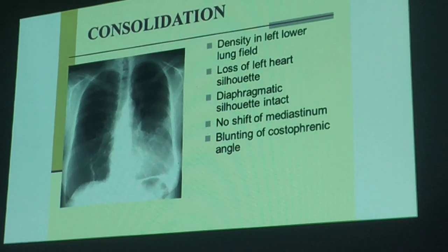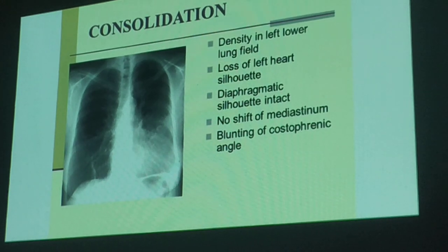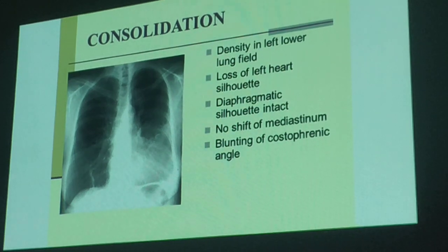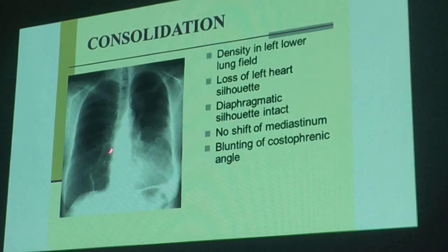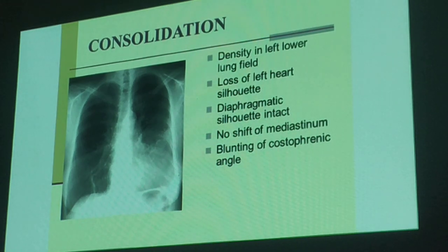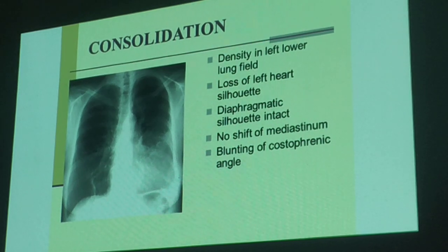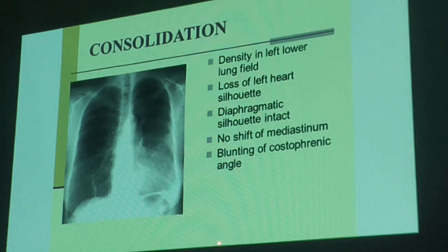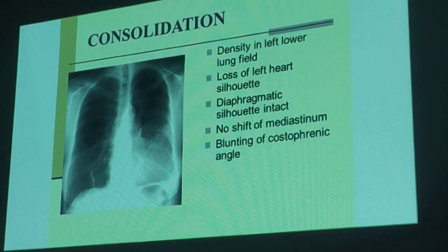Okay? You'll find it later that in atelectasis, the shift of your mediastinum would go to the affected side. Kasi may loss of volume. Kung dito ang atelectasis, may loss of volume yan, hihilaan niya yung mediastinum mo on the affected side. Whereas, in cases of pleural effusion, if you have your fluid here, ipupush niya ngayon yung fluid to the other side, to the normal side. Okay?